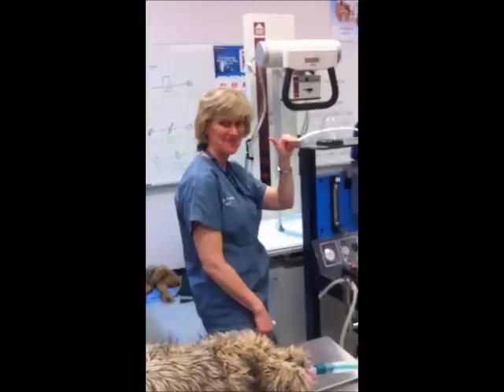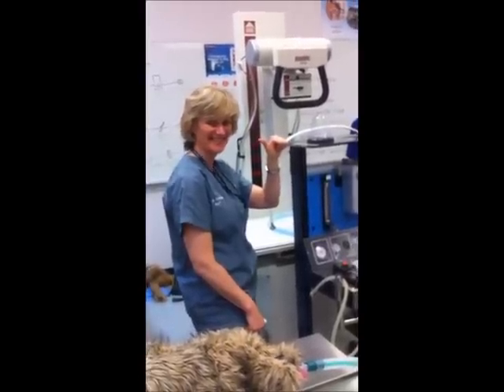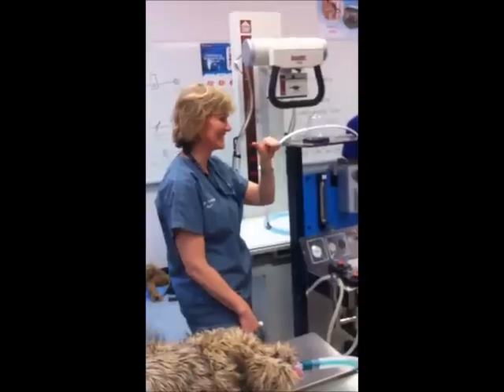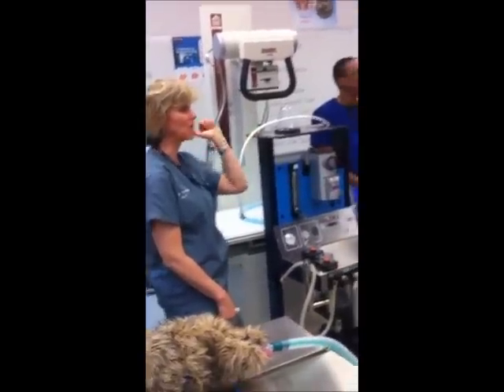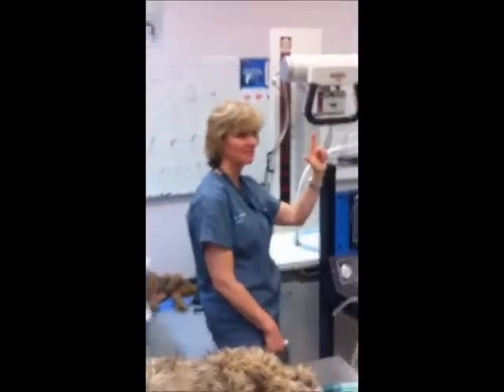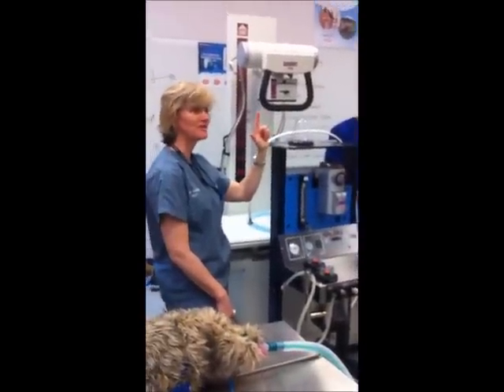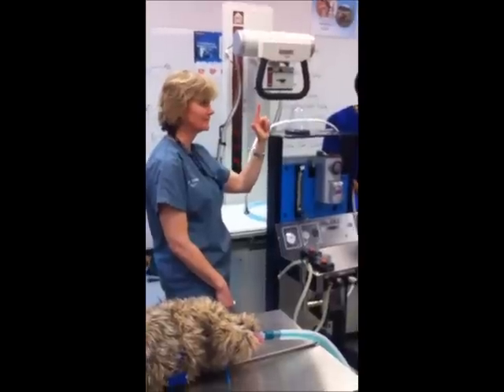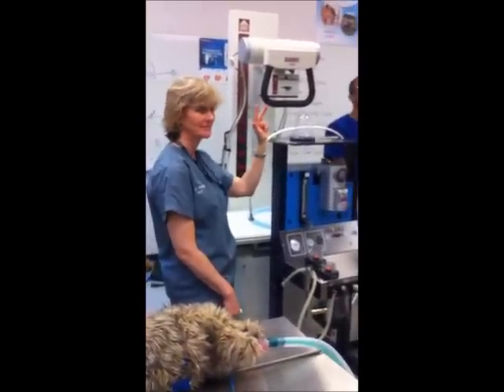What's it called? The esophageal stethoscope. Yes, I didn't even get that one. Doppler blood pressure. What else? The systolic thing. Systolic is the Doppler blood pressure. Oh, okay. Pulse oximeter. You've got some studying to do.